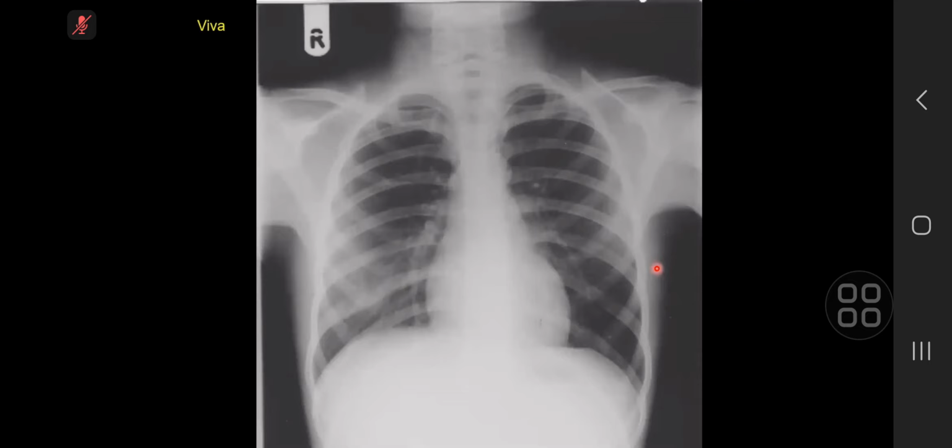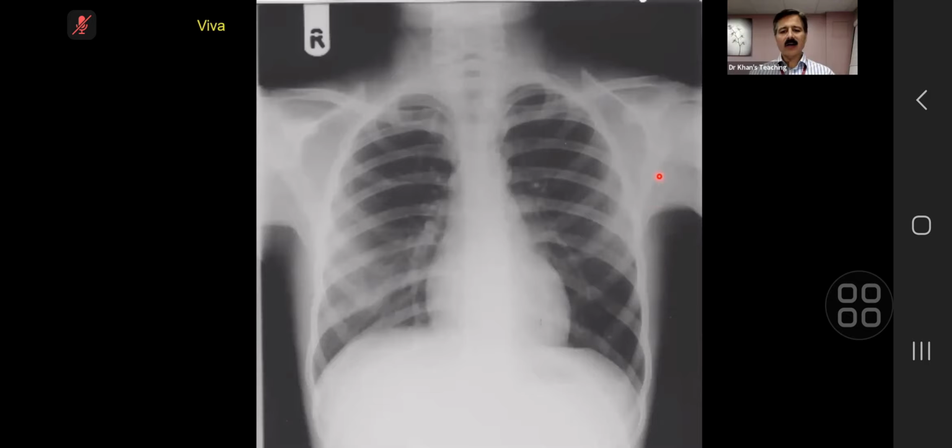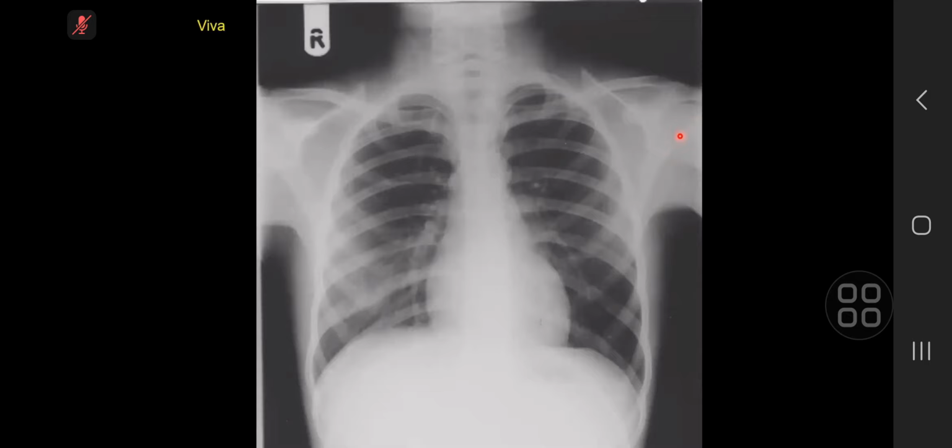So the epiphyses appear to be closed. They don't have much degenerative change. Probably a middle age. Look at this one. Look at this one. All right. Okay. So they're open.